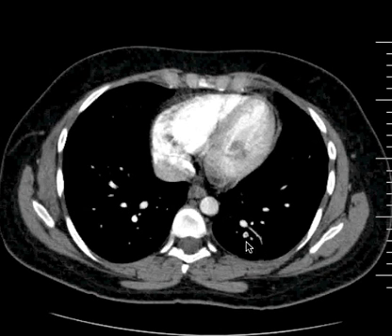They're close to one another. If you change the windows, you'd be able to see a bronchus, a bronchiole, right next to this pulmonary artery that's of comparable size to the pulmonary artery, unlike the pulmonary vein, which will not have an accompanying bronchiole.